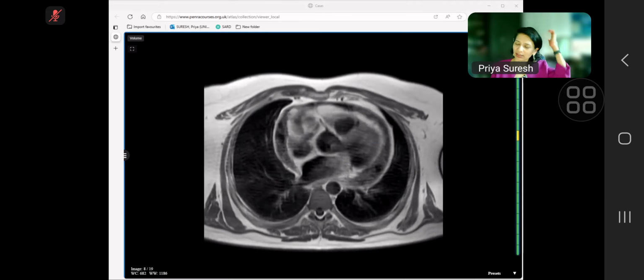Like you get malignant pleural effusion in lung tumors, you can get malignant pericardial effusion. So it was just in keeping with the theme of sarcomas. So I thought, okay, we'll include an angiosarcoma as well. Now you're seeing it, you know how it can look and what features it will have.